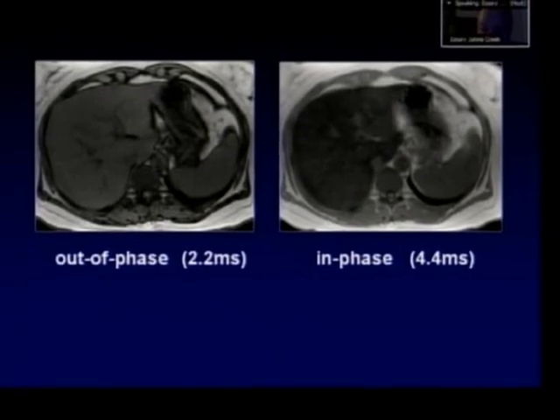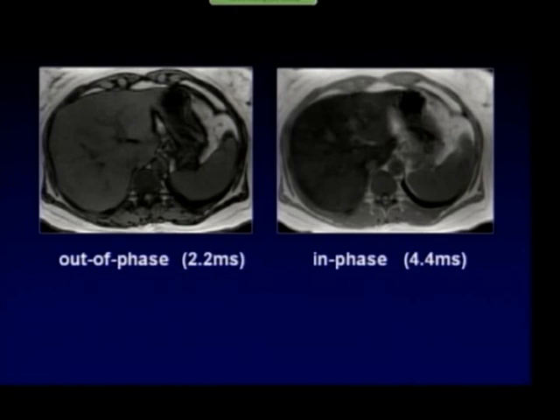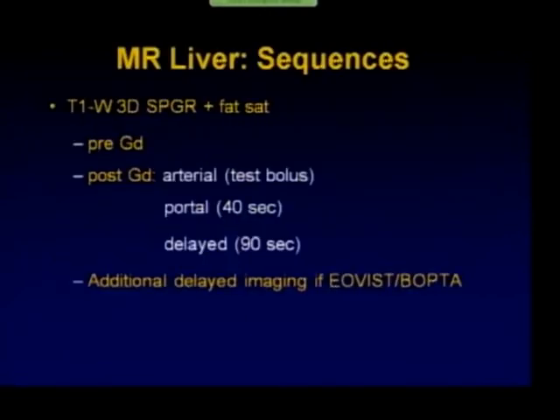There is also a phenomenon, a disease entity, where the loss of signal intensity is on the longer echo or the in-phase images. And the reason for that is that wherever there is susceptibility within the liver parenchyma or parenchyma of an organ, there is loss of signal intensity. And this occurs especially with hemochromatosis or hemosiderosis, because the susceptibility effects of hemosiderin or any metal in the local magnetic field causes inhomogeneity and loss of signal on the longer echo.